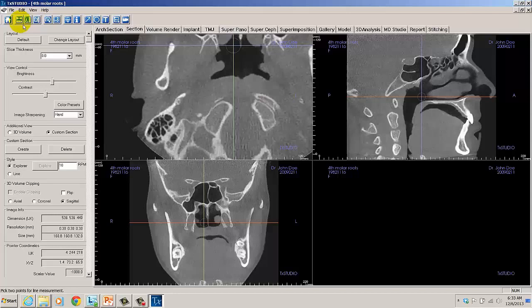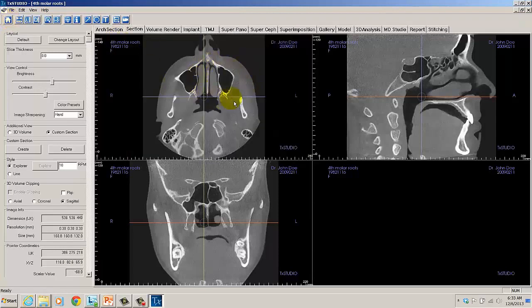But we have a nice tool on our toolbar. It's in the shape of a house, and if we hover over the icon as well as any of these other icons in the toolbar, then it would give us a descriptive text definition of what that button represents. But on the house, which is the reset view, let's just left mouse click that, and that would bring our image back to the default level.